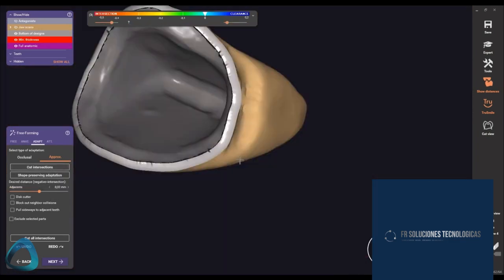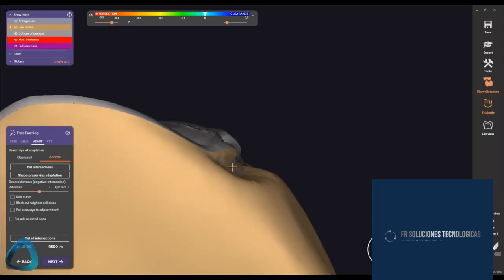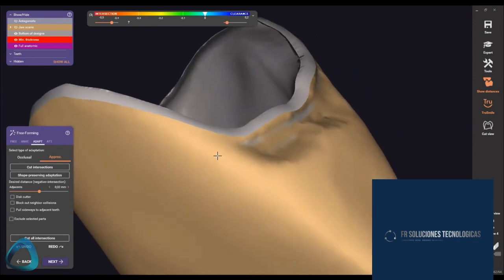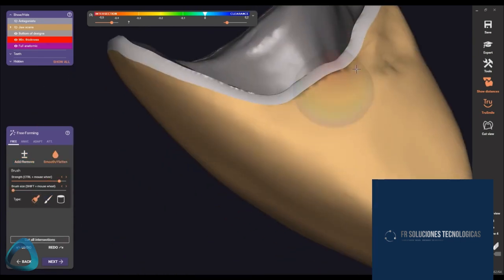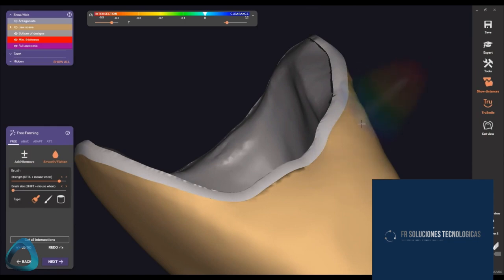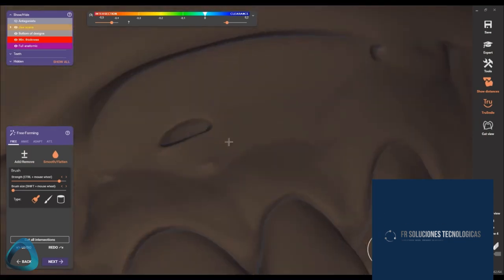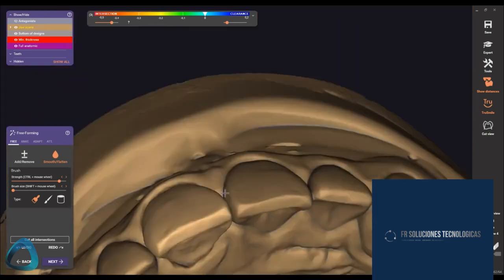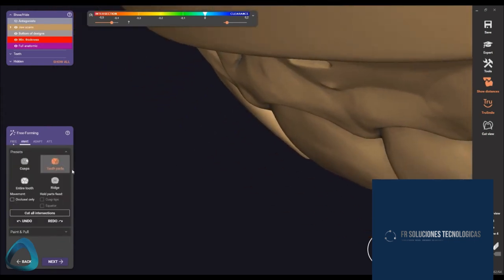Note that the software can't understand what is teeth and what is gingiva. That's why deformities like this can happen. Just go back there with Add and Remove tools and make it even again. Be careful not to smooth the contact points. If you don't want this to happen, just keep the last approximal cut intersections and do the contact adaptation manually by moving tooth parts or smoothing the surface.